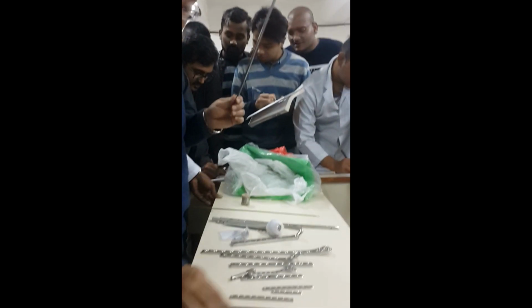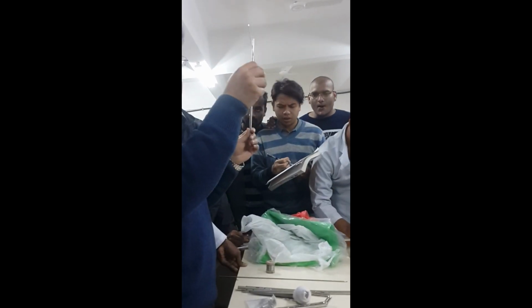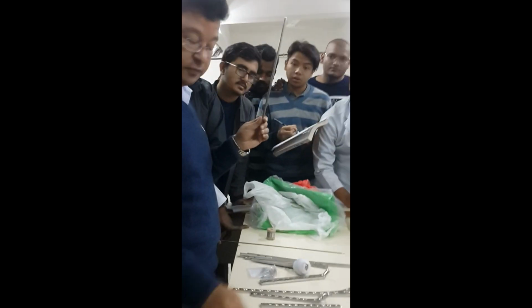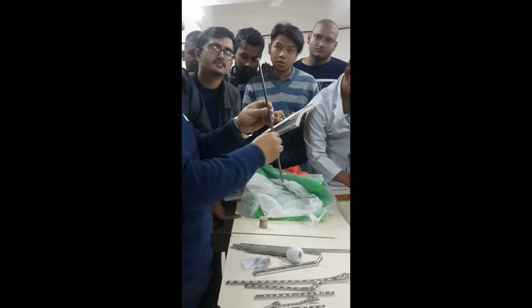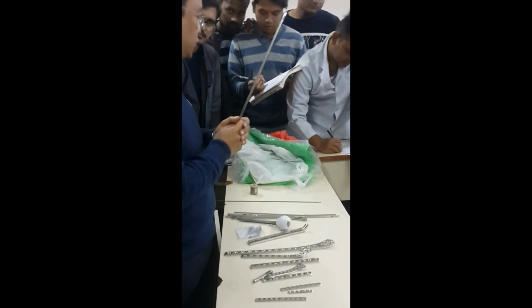Not to get confused with the K wire, which is the Kirschner wire. K nail is the Küntscher nail.